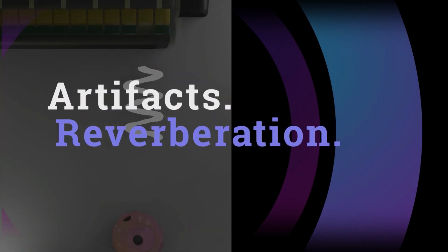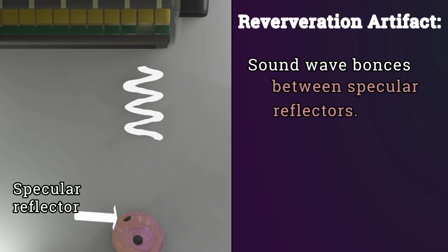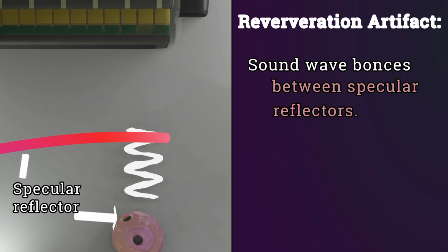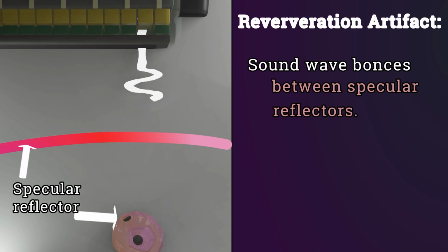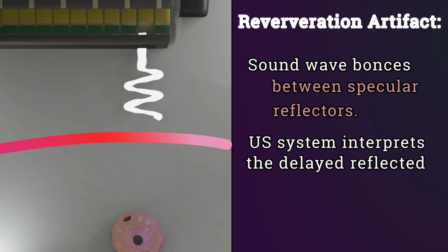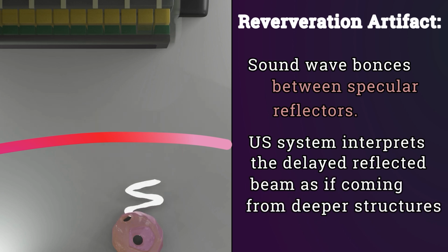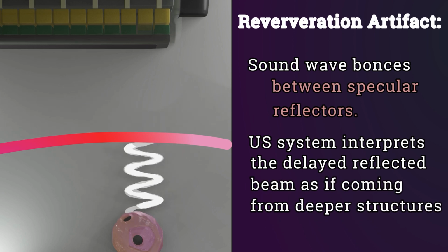Reverberation artifacts. Reverberations are formed when a sound wave bounces between two strong specular reflectors, which are reflectors that are at 90 degrees to the ultrasound beam. These strong reflectors cause the ultrasound beam to bounce back and forth between them. Once this reverberated ultrasound beam comes back to the machine, it interprets an image as if it's coming from deeper structures since it took longer to get back to the transducer.